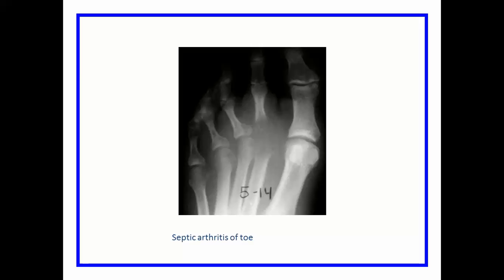Now another type of arthritis, infection. It's not hypertrophic degenerative or Charcot, but it is infective. Infective means destruction, and the best example is the destruction of the opposing parts of the bones forming a joint like this. Here the cause could be anything.